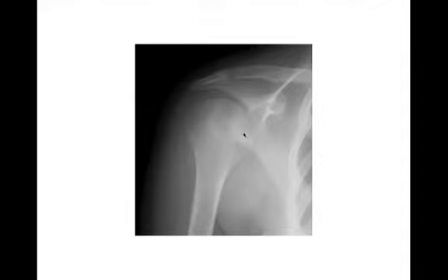Radiograph of the shoulder. Here we have a geographic lytic lesion. This lesion is eccentrically located in the epiphysis of the proximal humerus. It has a narrow zone of transition and a sclerotic border, so a geographic 1A lesion, slow-growing lesion. This is a young patient. It's an epiphyseal lesion. So really, this should be a chondroblastoma. That is going to be one of the thoughts that springs to mind.